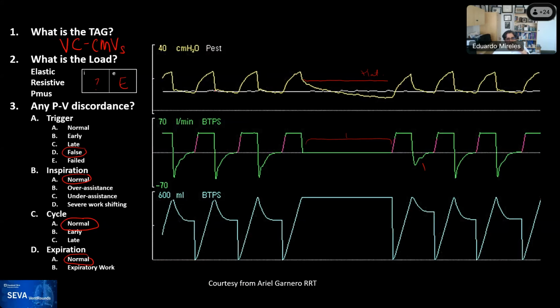And then there's this little gray line that has a lot of tortuosity. And the reason is because this ventilator had the electrical activity of the diaphragm on to try to catch if there was any electrical activity of the diaphragm. And you can see essentially that there is no electrical activity. So this was a good case of false triggering due to a very large leak on the system. And so with the large leak, every time the air was leaking, the ventilator feels that the patient is taking an effort.